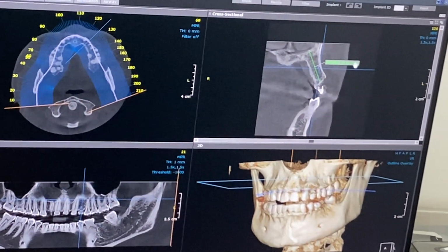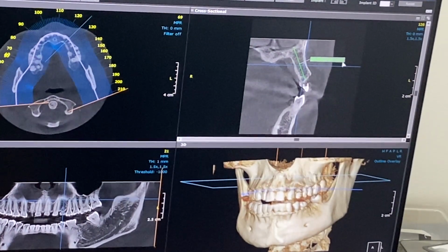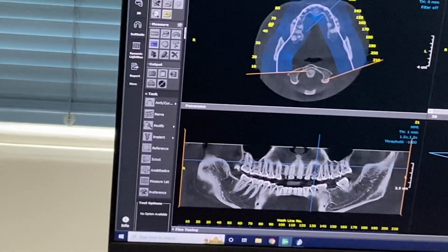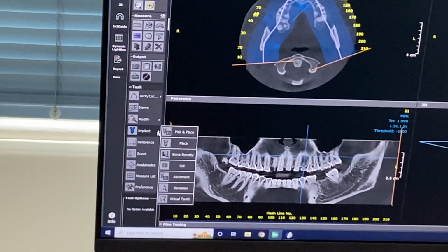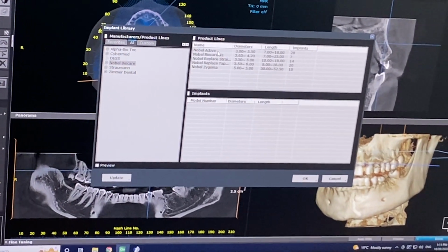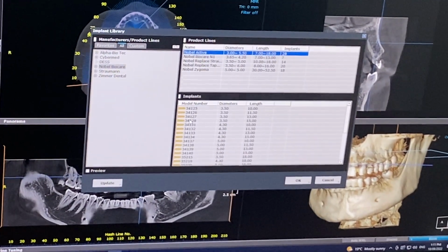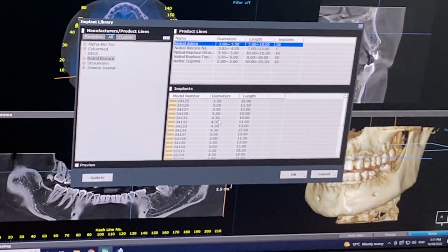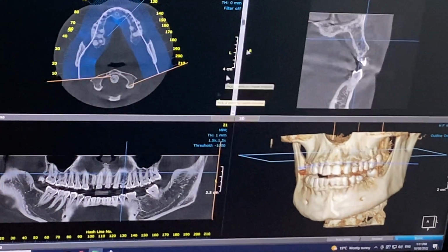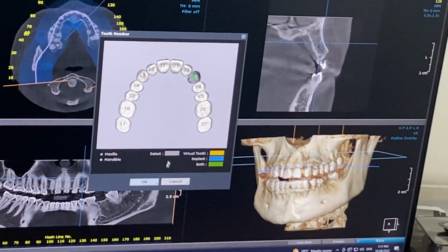So I know on that basis you might use a slightly more aggressive implant thread. So I know the dimensions. I now go straight over to the implant selection, pick and place. I'll use a Nobel Biocare one from here. Nobel Active is a more aggressive thread. You can put your own implants into that? Absolutely. You can customise, put your own library in, that's right. So I'm going to say, look, let's do 3.5 at, say, 11.5. Just touch the area, and it's going to be up there in the 2-3 position.